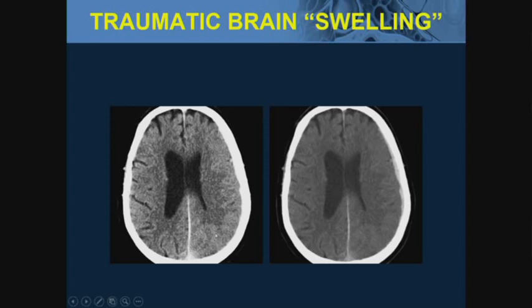This patient is having a really bad excitotoxic brain swelling, and this is life-threatening. It is not the 2 to 3 millimeter subdural that's life-threatening. It's the brain swelling that's going on underneath it.